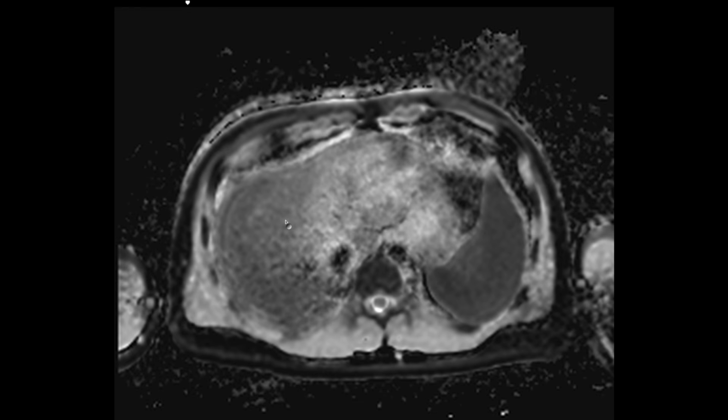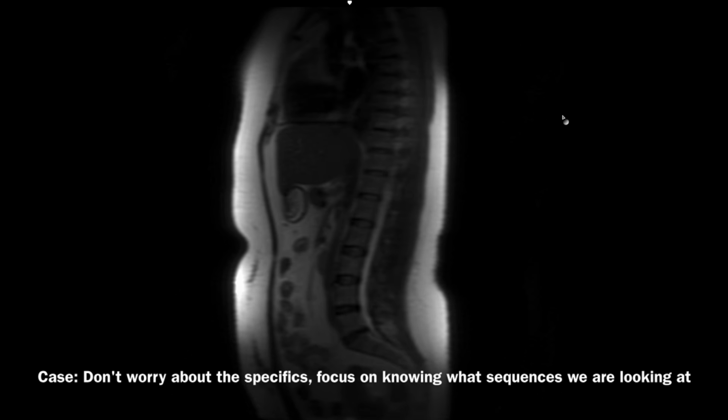Okay, so that's it for a normal abdominal MRI. And we've gone through the sequences, shown you what the tissues generally look like on a normal MRI abdomen. Let's go through a quick case, and then we'll call it. Okay, so this is a quick case that does have abnormalities in it, and we won't go through everything, but we'll go through it briefly.